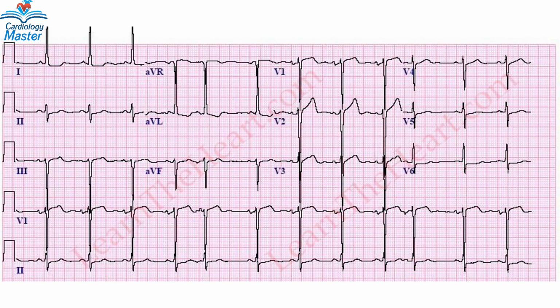Let's have a look at this ECG. Is it sinus? It is positive in 1, 2, and AVF, negative in AVR. The PR interval here is constant, so let's take lead 2 as it has a long strip. It's constant with the same shape, constant with the same shape, but here no, there is a difference. It is irregular, although it was sinus, but it became irregular. The P wave morphology is different and the PR is different.